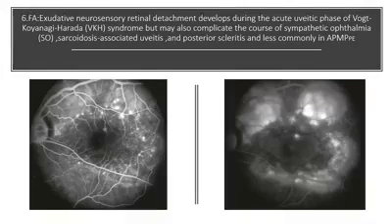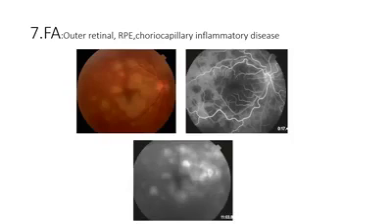Also, fluorescein angiography is very useful in inflammatory diseases involving the outer retina, the retinal pigment epithelium, and the choriocapillaris. And we can see here in this patient with acute multifocal posterior placoid pigment epitheliopathy, multiple whitish creamy lesions that are usually seen on fluorescein angiography in the form of black hypofluorescent spots in the early phase, and then hyperfluorescent spots in the late phase because of the staining.